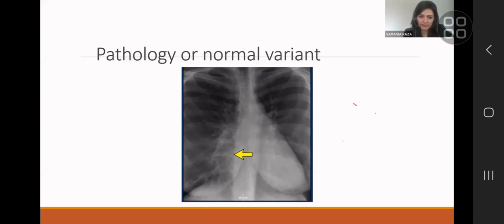What it is, is something called pectus excavatum, which is the depression of the sternum, and that can be further classified in regards to where that depression is, the top half or the middle half. It has certain severities in terms of how much that compression and that narrowing of the chest is.